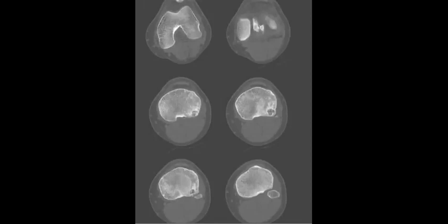Then the narrow or wide zone of transition, any periosteal reaction, cortical breaching or endosteal scalloping. So I see, Shayma, yeah, it could be a lytic lesion. The location is important. There is sclerosis of the margin.